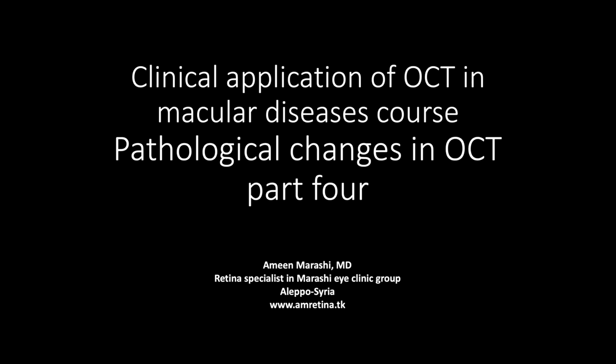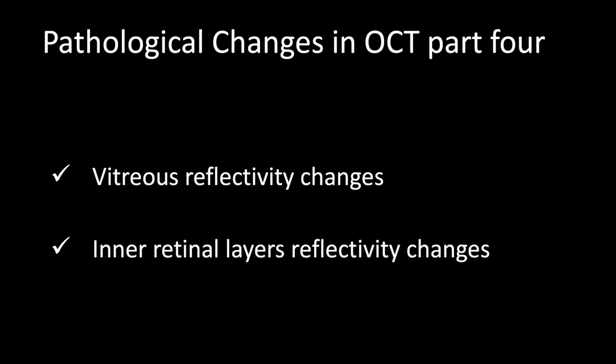I am presenting the course of OCT for macular diseases. In the previous presentation, I discussed the structure changes in the outer retinal and choroidal tissue. In this presentation, I will discuss vitreous and inner retinal layers reflectivity changes.